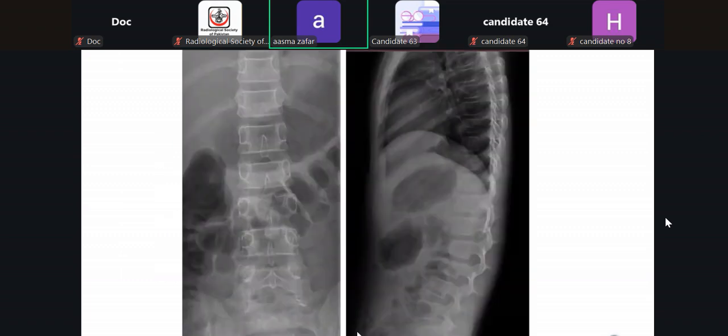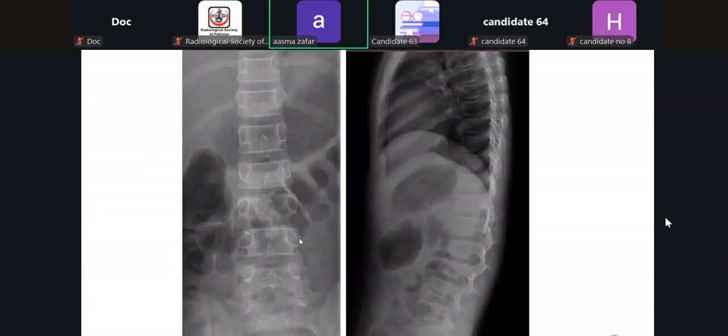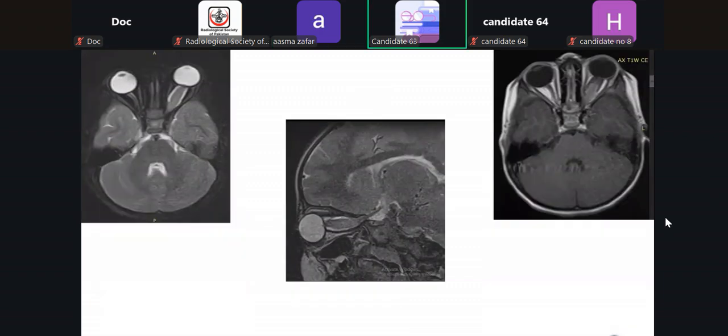Okay. So calcaneal fractures are significantly associated with lumbar vertebral fractures. See, this is L5, L4, L3. You can see the crisp outline of the rest of the vertebrae. Where is the lower outline of L3? Just see the anterior wedging. So for any calcaneal fracture, you have to evaluate the spine. Don't send the patient back home with a back slab and just the orthopedic evaluation. Okay. And you were on the right track.